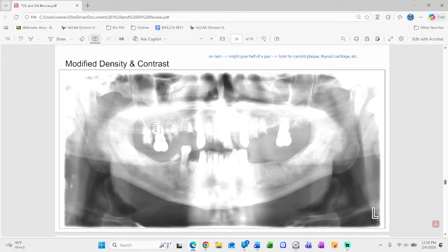Okay, one more time, this is the thyroid cartilage here, the corner of the thyroid cartilage. Here's one arm of the hyoid coming into the body, and then out the other arm. You know it's a U-shaped structure. And then here's my epiglottis right here. There's my soft tissue epiglottis right there. Right in here, this side, here's my epiglottis. And then there's my hyoid. Good? Yes.